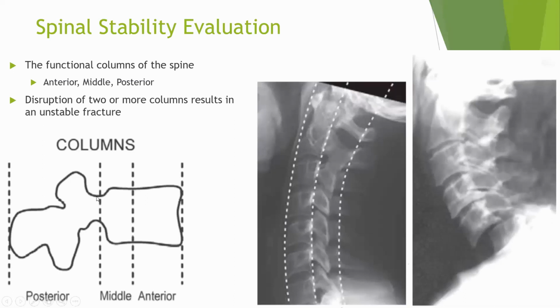So there could be spondylolisthesis, spondylolysis or Scotty dog appearance, fracture of the lamina. In any fracture or trauma of the spinal segment, there would be some amount of slippage of the anterior body or posterior segment of the column of the spinous process somewhere in the body. If these three columns are not in an equal line, then with 2 or more disrupted, for sure there is instability, or the spinal segment is unstable. Better to refer to a spine surgeon or a concerned physician to recheck and re-evaluate.